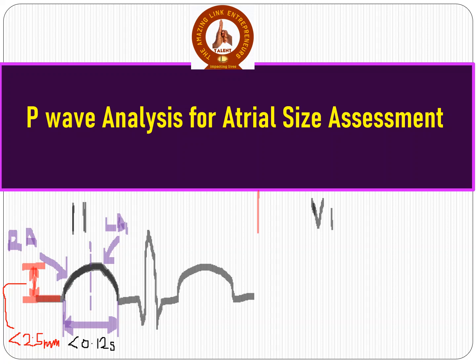So look at the presentation of the P wave in V1. The shape is biphasic.